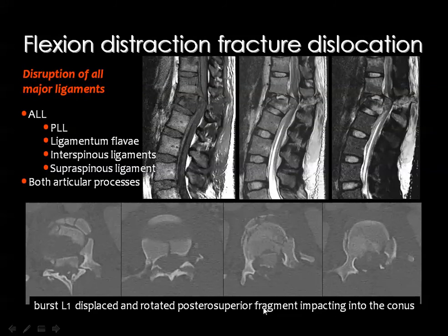And this is an example of a fracture affecting all columns of the spine by CT and by MRI. By CT, you can see the comminution of the vertebra, and you see the sagittally oriented fracture, and you see a fracture of the neural elements, and also you can detect the large intraspinal displaced bone fragments. And in the MRI, the fracture affects this vertebral body, which is posteriorly subluxated, encroaching on the spinal canal and compressing the distal part of the spinal cord.